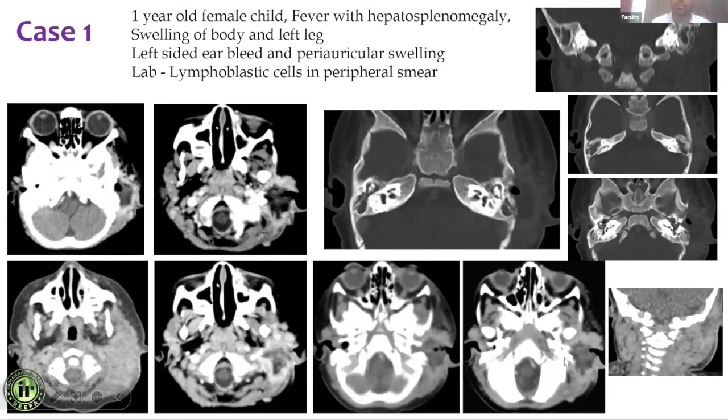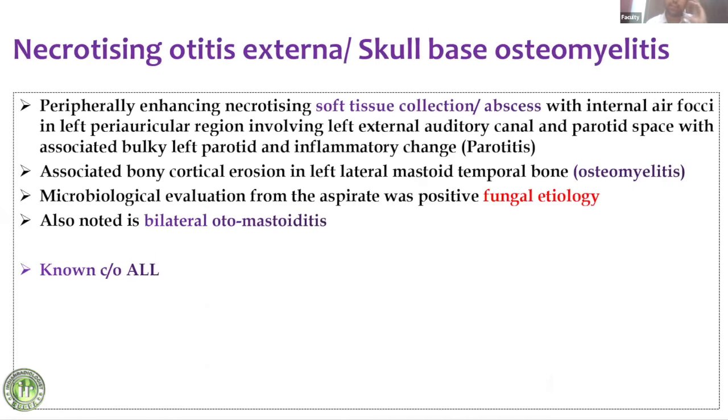You can see one of the earlier features of the inflammatory change in the region of the temporomandibular joint, just posterior to the mandibular condyle. You can see the stranding of this fat. You can see the clear fat here. So it is one of the early sensitive signs for the detection of skull-base osteomyelitis. So you have to have that degree of clinical suspicion to find out the actual diagnosis in this case.